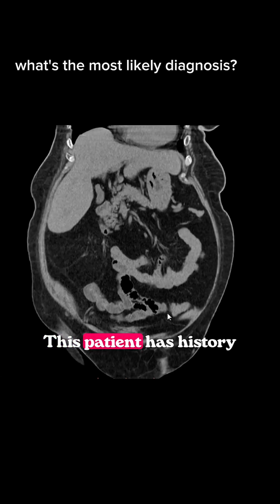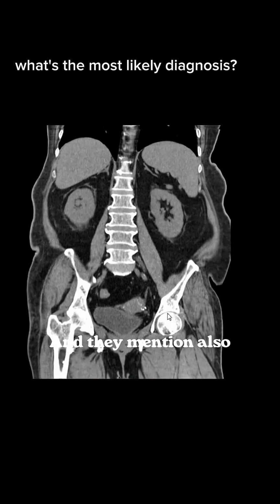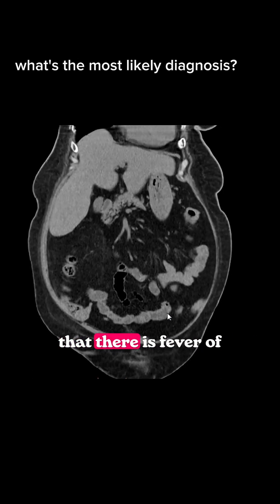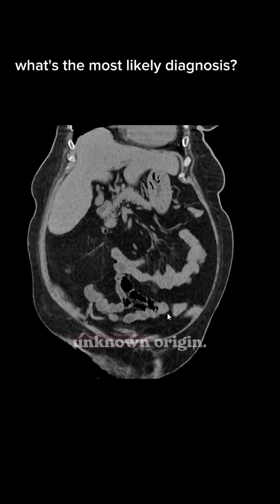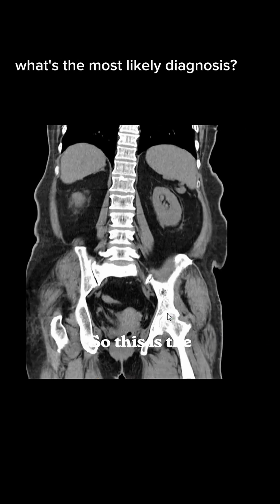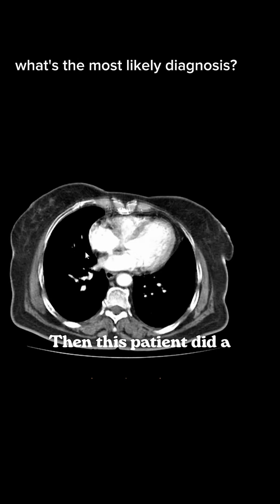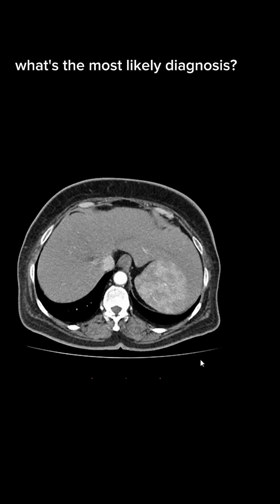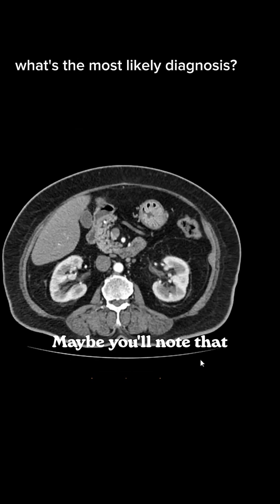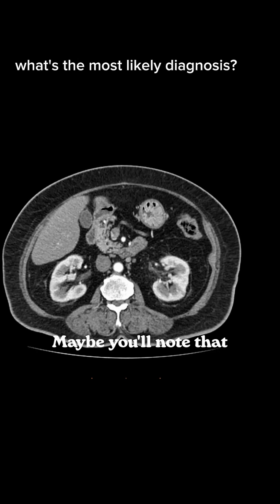This patient has a history of unexplained weight loss, and they mention also that there is fever of unknown origin. She is 59 years old. So this is the non-contrast images. Then this patient did CT with contrast as well. So this is the post-contrast CT. Maybe you note that there is hepatomegaly, and we check the rest of images.